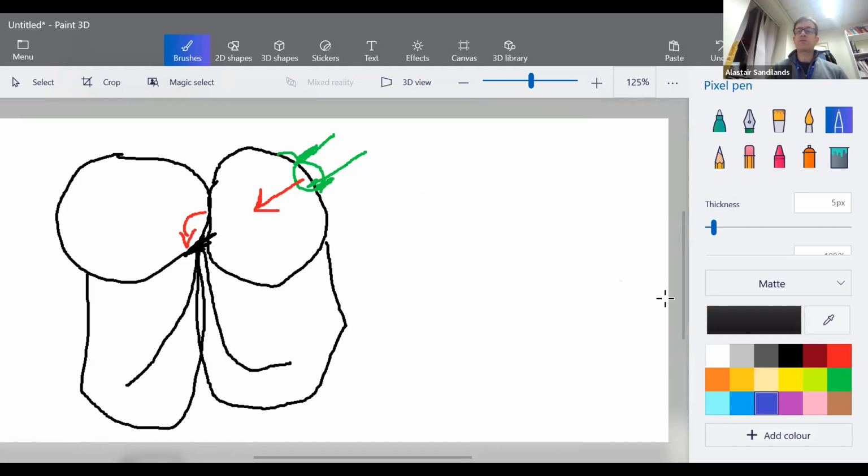So if it's coming from the pulmonary vein, what we'd expect to see is a discrete P wave, depending on the shape and which lead it is. A focal discrete P wave, which is the firing here of the, let's try and do that in green. So now it's coming from the pulmonary veins, it's positive, discrete, and it stops. And before the next one fires, it keeps firing. It goes down to the AV node.